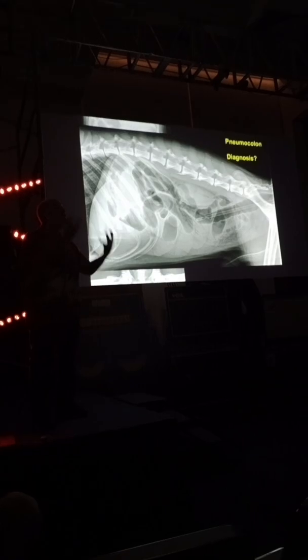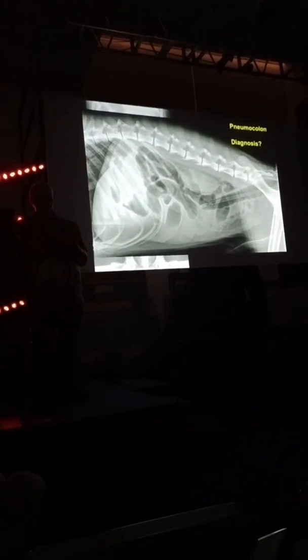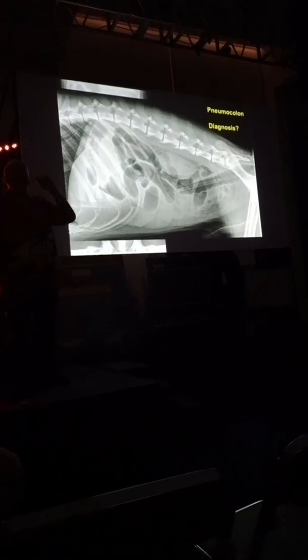See the pattern? See how linear it is? This should be linear. So when I see linear, what am I thinking of?